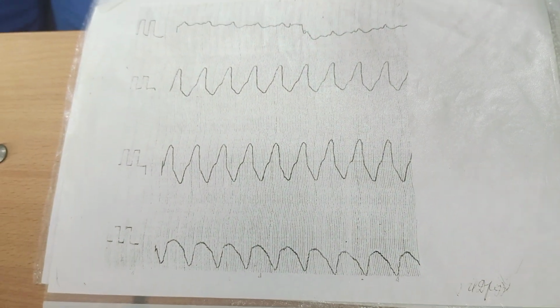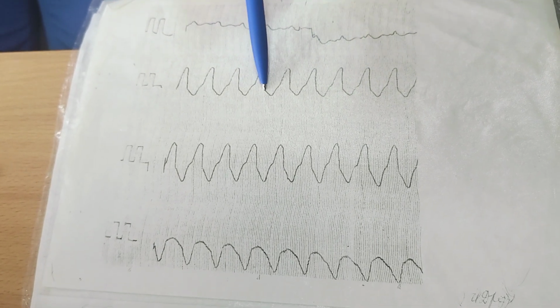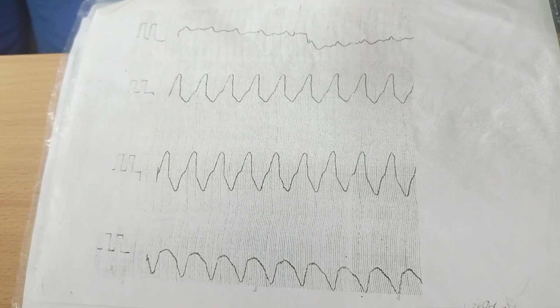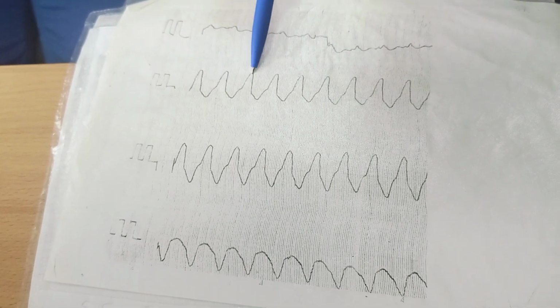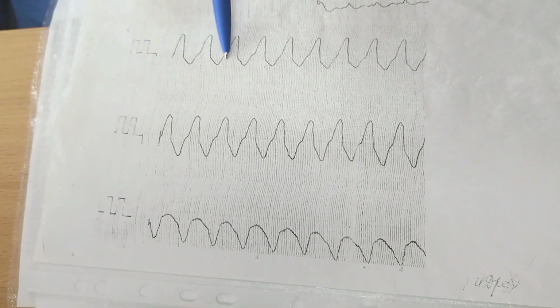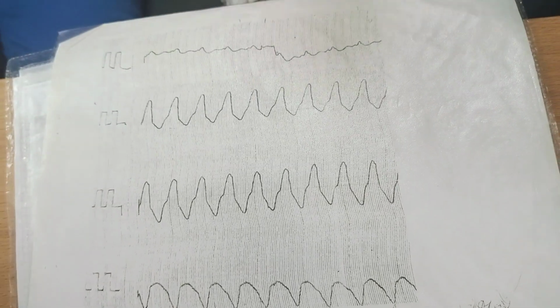What is it? It's ventricular fibrillation. There is tachycardia. QRS complex is wide and deformed. So it is ventricular tachycardia or fibrillation. Fibrillation is asynchronous. These are the same, synchronous, it's rhythmical. All complexes are similar. That's why it is ventricular tachycardia or flutter, but not fibrillation.